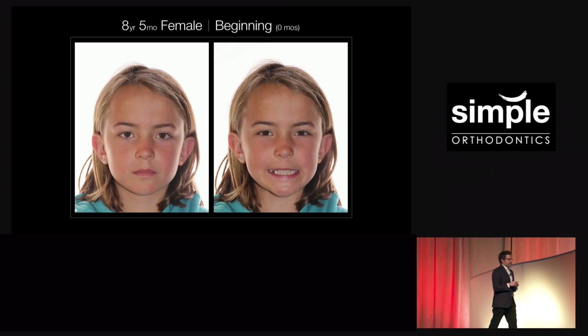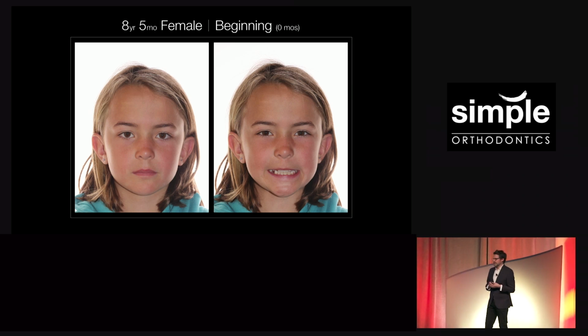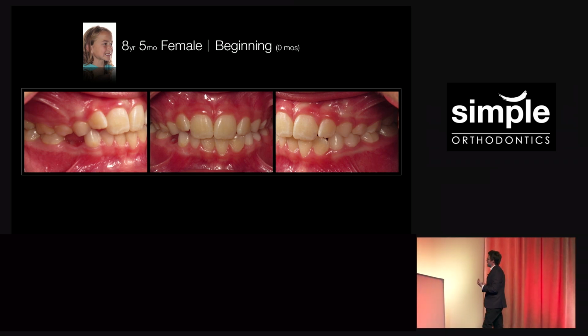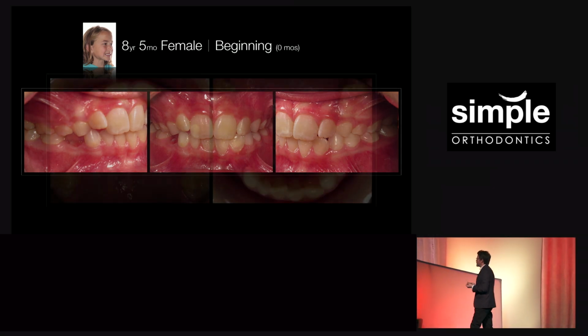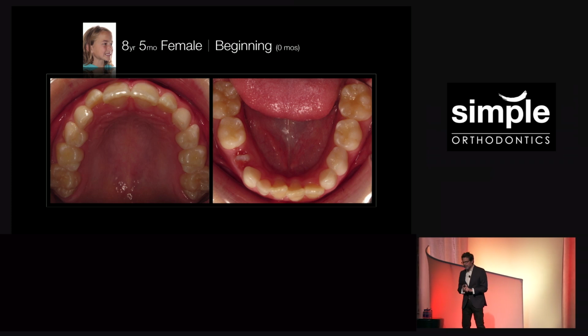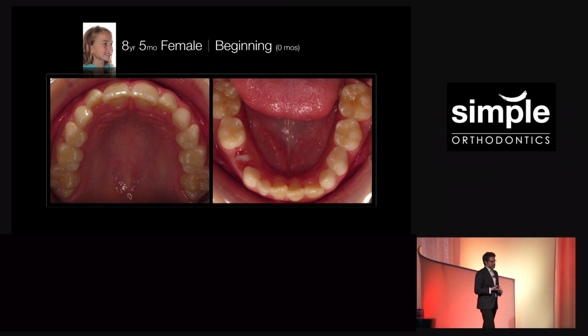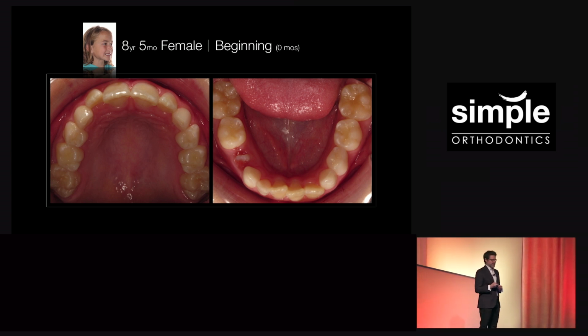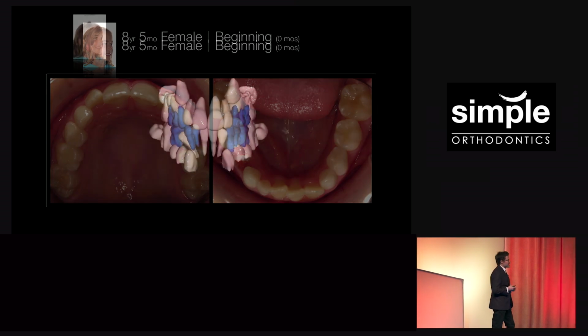Now, my impactions became more complex. And again, initially I thought this is all I got into cone beam for. So meet Annabelle. Here's her malocclusion. I want you to look at the occlusals. She lost her lower right primary first molar, and that's not the bicuspid coming through. That is her lateral incisor.